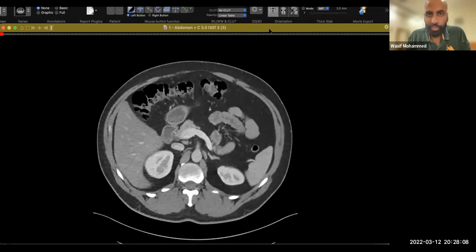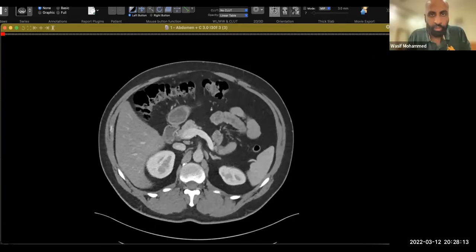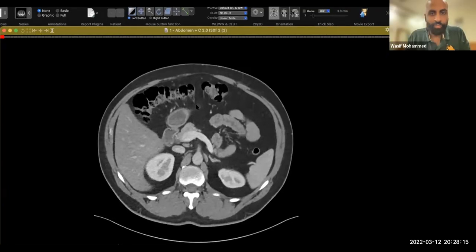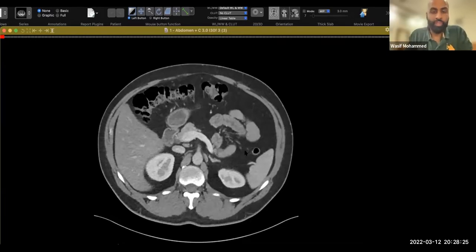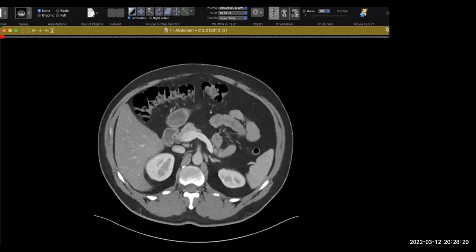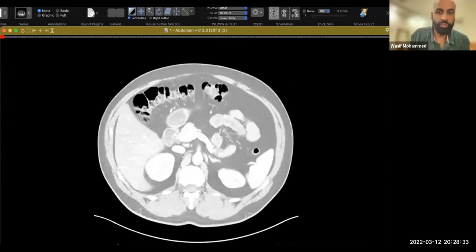So, Kavya, is it the first participant? Yes. All right. It's me. So, can you request remote control from me? Okay, I have sent you the request. All right. So, tell me what do you think about this case? Okay, so I'll just go through the images. Sorry, just let the mouse go. Let me just reset.